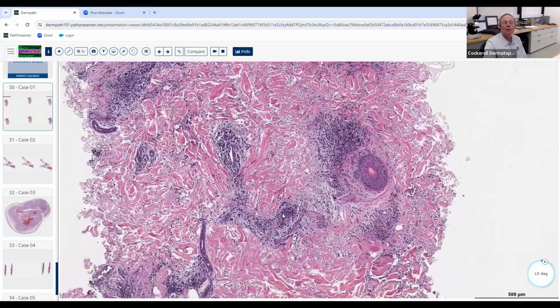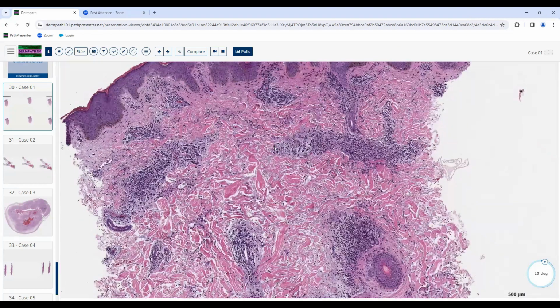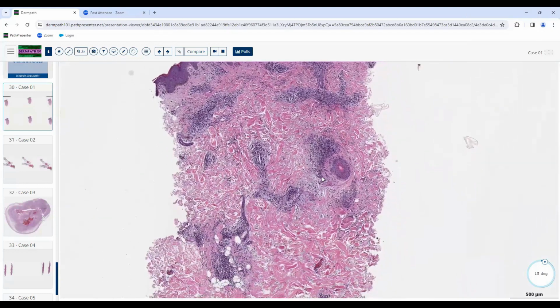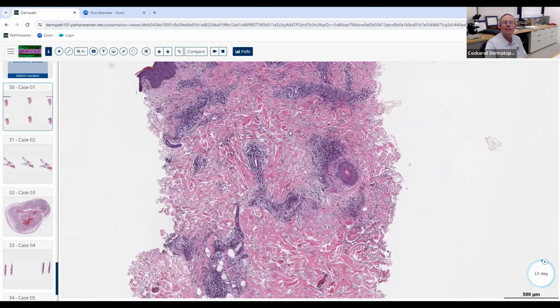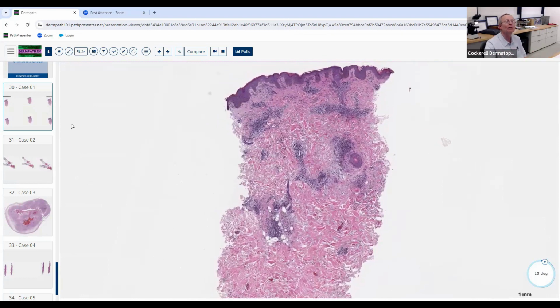You're close. Like an acute cutaneous lupus? No, that doesn't usually give you superficial and deep, and it also gives you interface change with vacuolar alteration. Oh, that's right. Oh, tumid. Tumid form. Yeah. Tumid form, like a swollen plaque that's got no epidermal change. So the tumid form. Good. This is lupus, so you're right, and you're right about the 5 L's.